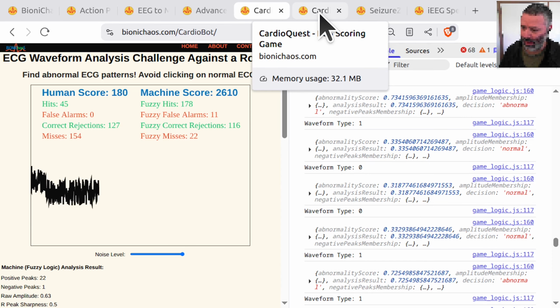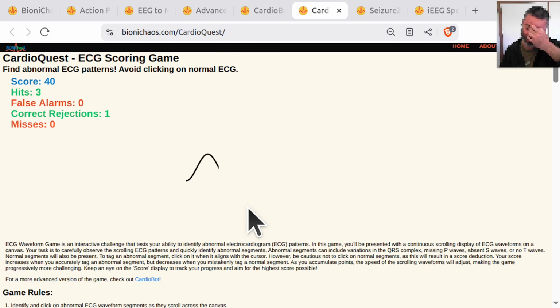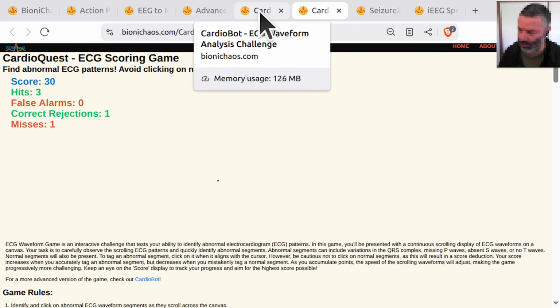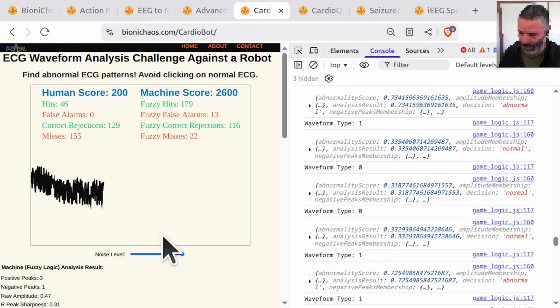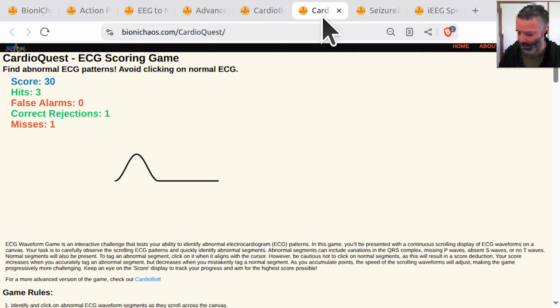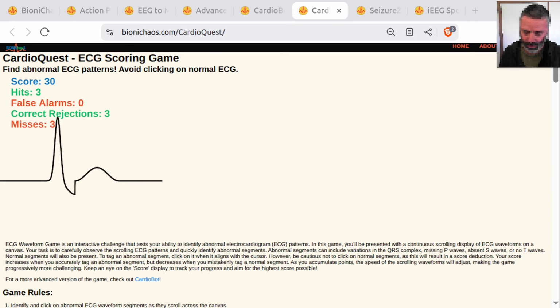So the question really is, can we combine these two? So make it standalone, vanilla JavaScript, so it can run in your browser instead of on my server, but still have you labeling, playing, competing against the robot. I'm pretty sure we can, but we'll let the bot talk for 3 minutes. Again, AI alert. If you don't like AI, you can skip 3 minutes.